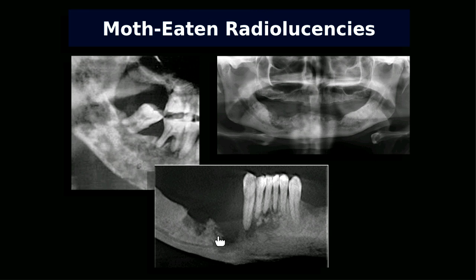Margins are not really well defined. You have to actually guess a little here, which I don't like. So if it's like that, then these are moth-eaten appearance in this area. In the mandible, you can see that on the pan too.